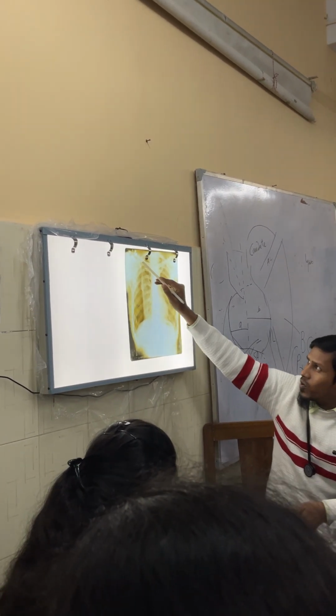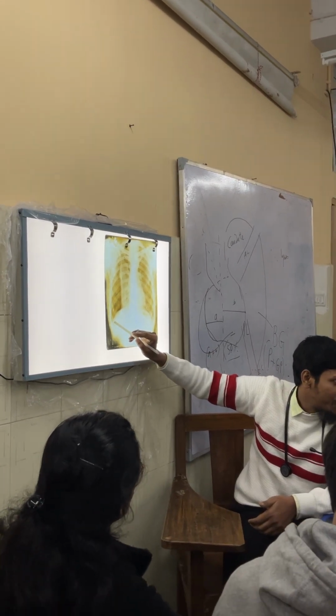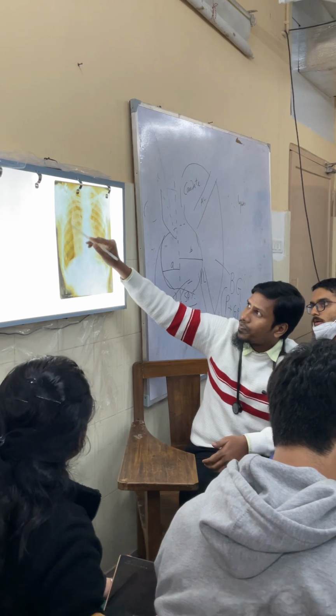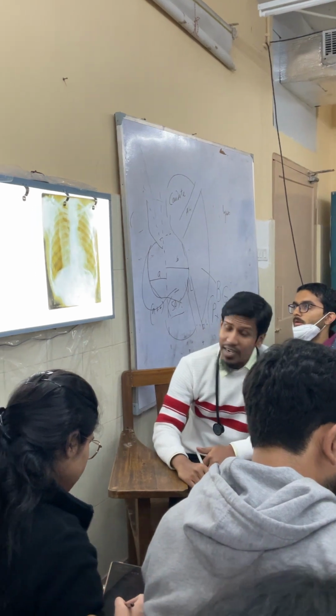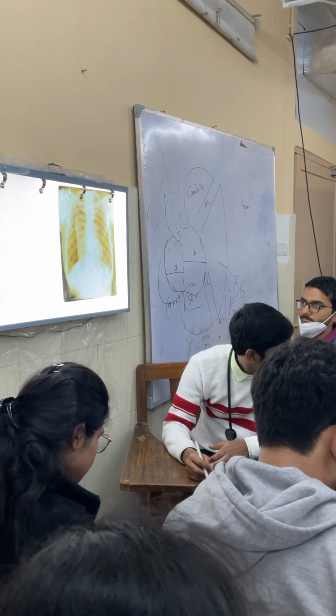So this entire part is the air. The air is in between the lungs and the rib cage, that is the parietal pleura, so parietal pleura and lungs. So there is the air, so from the lung field there is a right sided pneumothorax.